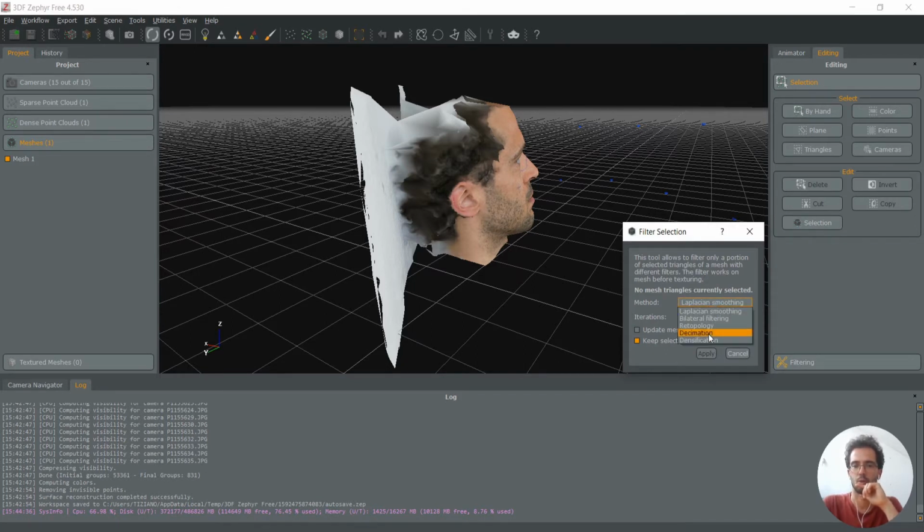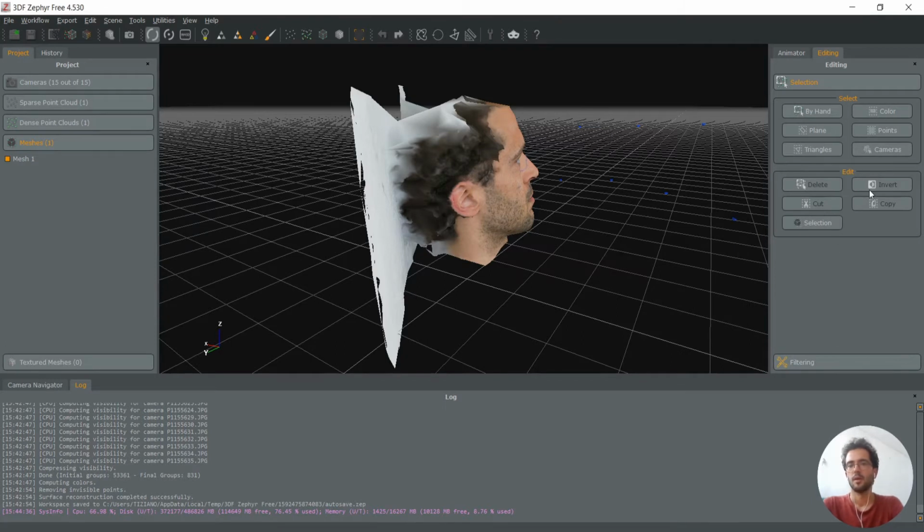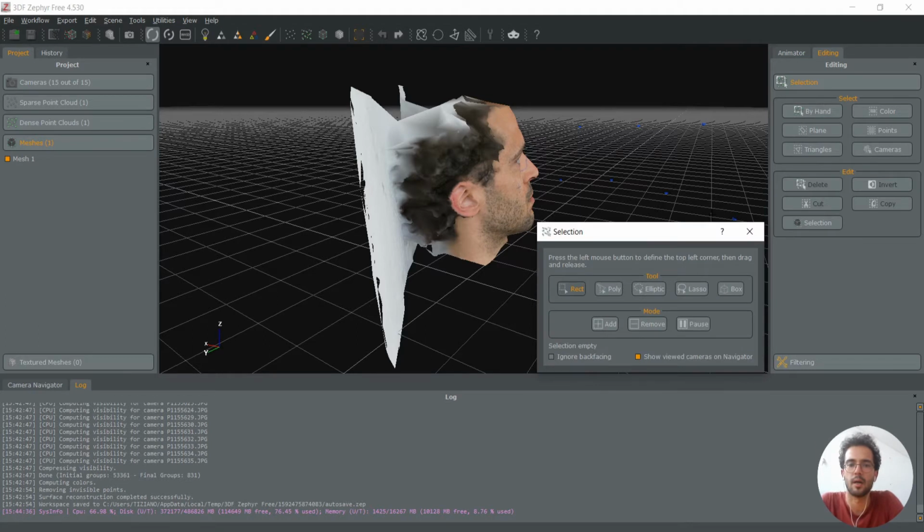So here you can choose decimate, densify, retopology, filter, or smooth just some part of our mesh. But we don't need it for our purpose right now because we will make these modifications directly in Meshmixer when we start to model our parts. Okay, we close this part, and right now we choose to select by hand because it's a pretty easy part.